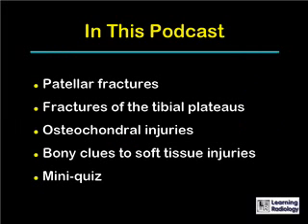In this podcast, we're going to look at patellar fractures, fractures of the tibial plateaus, osteochondral fractures, bony clues to soft tissue injuries, and there'll be a mini quiz at the end.